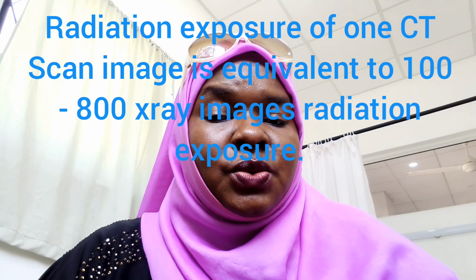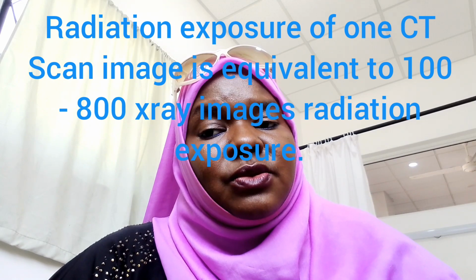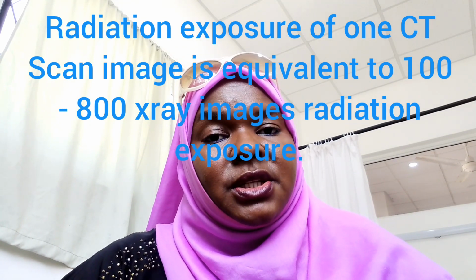Nevertheless, X-rays are cheaper, and the amount of radiation compared to a CT scan is way lower, because one CT scan could range between 100 to 800 X-rays. So it would take at least 100 to 800 X-rays to reach the level of radiation one would be exposed to in a CT scan.